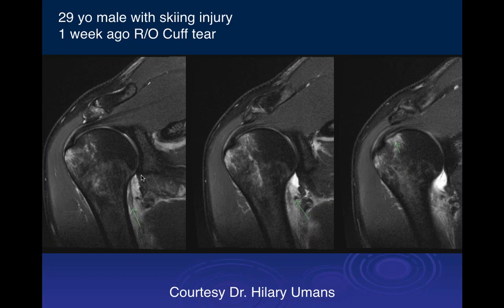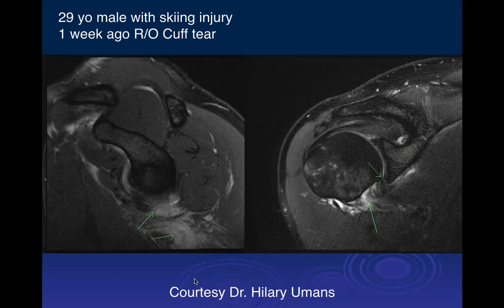In this particular case, the inferior labrum looks like it's intact. Though again, I'm a little concerned that there could be a little dysplasia of the glenoid that might have predisposed the patient to have an inferior dislocation, which would make the treatment more difficult.